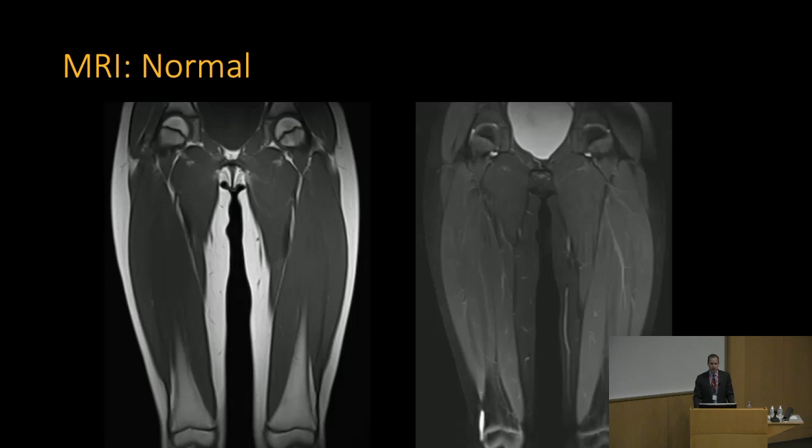So these are coronal images, and this is normal as well. You can see here, this is the T1 on the left and the STIR on the right. And this is a typical set of images from one of our JDM protocols. And you can see that we have a really nice look. I link these side by side as I scroll. On the PAC station, I can assess the T1 and the T2 signal within a muscle. So if I see that there is edema in one muscle, I'll go straight to the T1 and see if there's also some atrophy or fatty infiltration of that same muscle group. And I can also look at the joint fluid, the bone marrow signal, and all of that at one time.